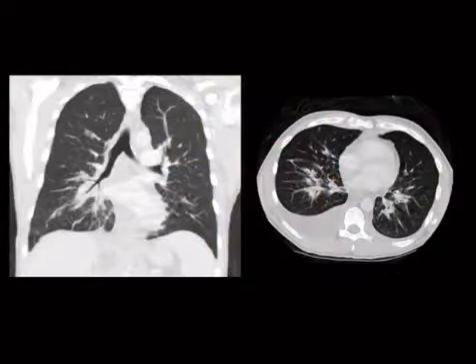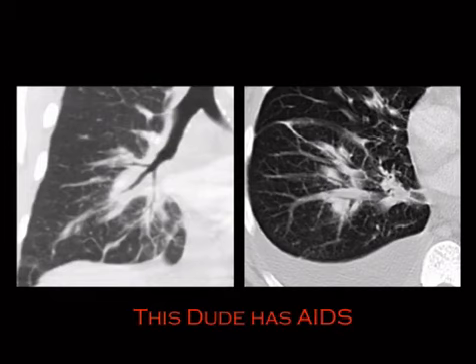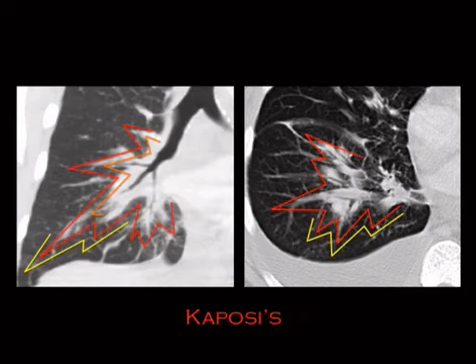Here's another case. Zoom in, give you a hint. I'll either have to tell you. So this is one where they wouldn't have to tell you. This is an Aunt Minnie. They would not have to tell you that the guy has AIDS. I'm being nice and telling you. In contradistinction to the PCP case, where you have ground glass, which can basically be anything, this is a more Aunt Minnie type appearance. So this is the perihilar flame-shaped opacities. This is Kaposi's.